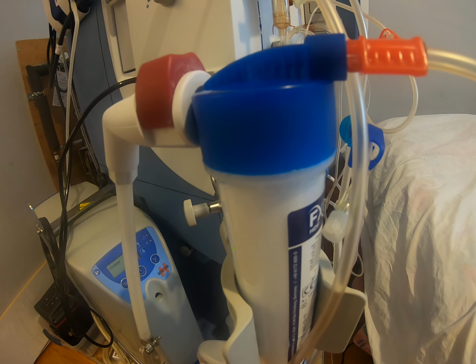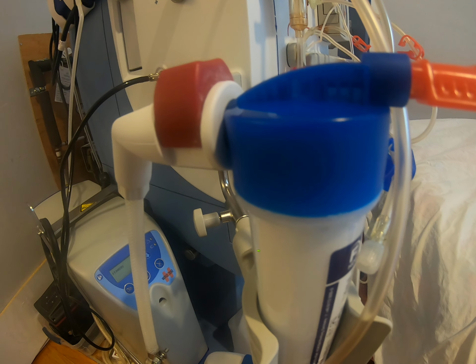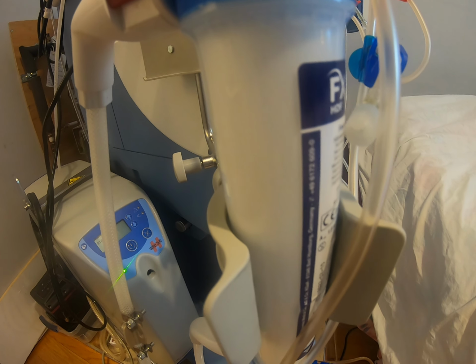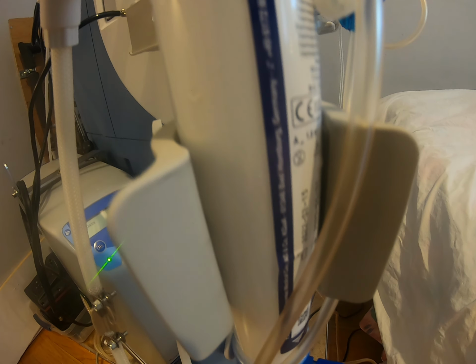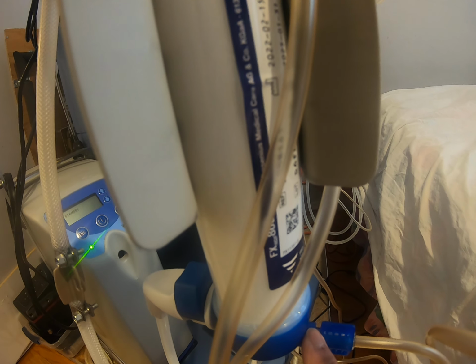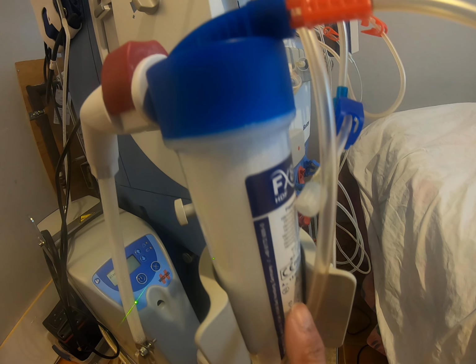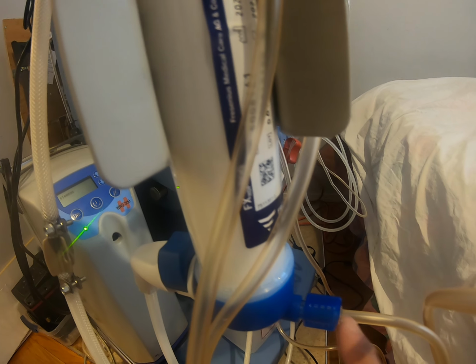And of course, the process involved here, as we mentioned earlier, is ultrafiltration with the aid of transmembrane pressure, or the TMP, and diffusion. So now we have clean, filtered blood here at the bottom, going to our venous line. Dirty blood from the top, after all those processes, is now clean, filtered blood at the bottom.